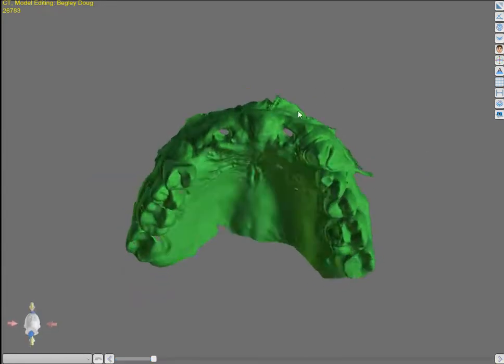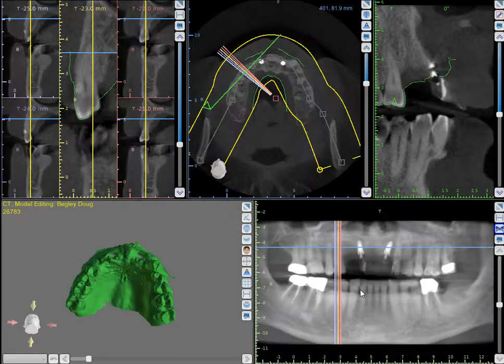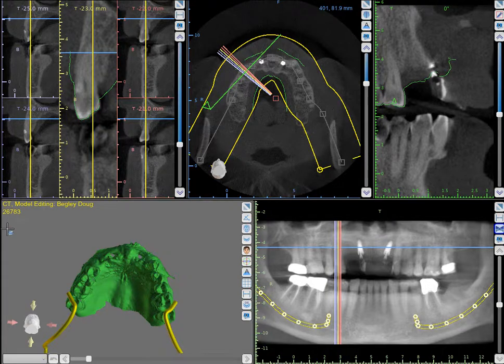This patient currently has 2 implants and is looking for another implant in number 6. So do we need to map the mandibular nerve for this case? We do not, but we can. We can run an auto detect function and be able to map the nerves on both sides, just to show how that works. Current AI features help make this pretty easy.